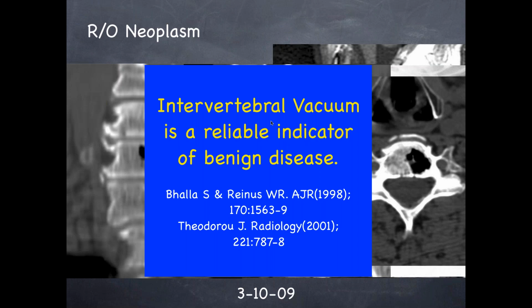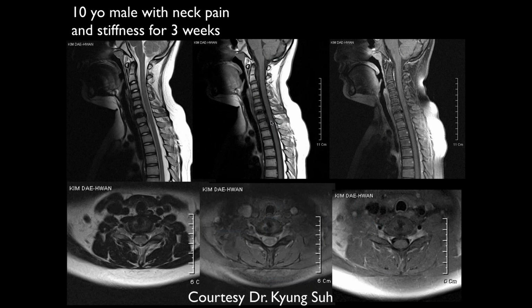Is that a vacuum disc with herniation or something? Yeah, this is the same as the previous one. And then there are several papers in the literature that have shown once you see gas, it's a reliable indicator that you're not dealing with malignant disease or infection for that matter. Okay.